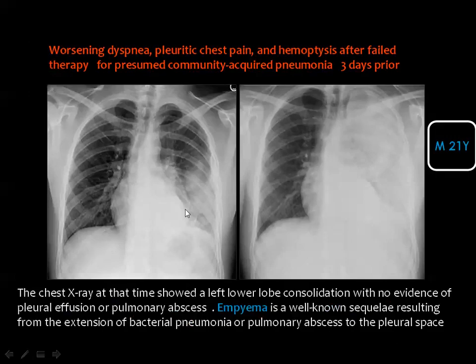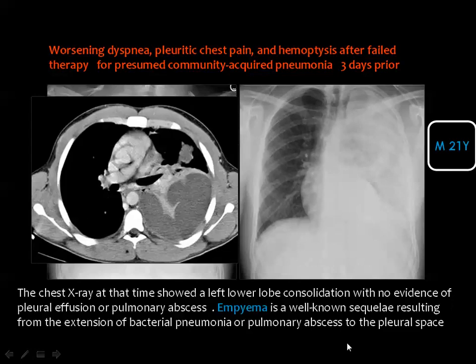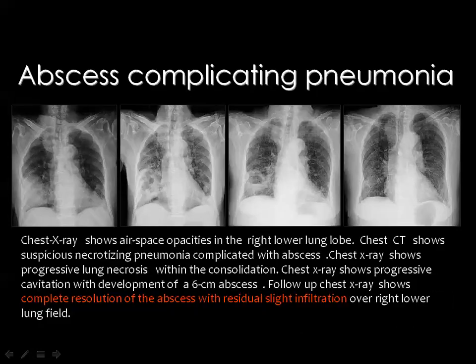In this patient, you can see an opacity in the left lung, and this opacity has progressed to obliterate the whole left hemithorax, and you should at that time suspect that there is a pleural disease associated with this pneumonic consolidation. And whenever you have the CT scan, you can see a pleural empyema compressing the left lung with enhancement of the pleural surfaces, denoting an associated infection.